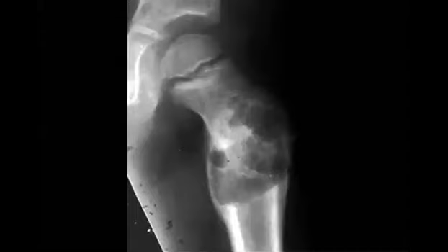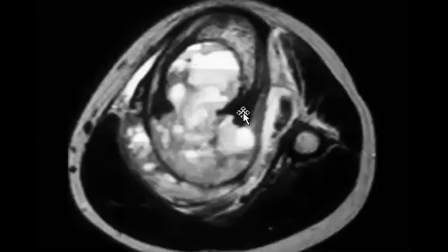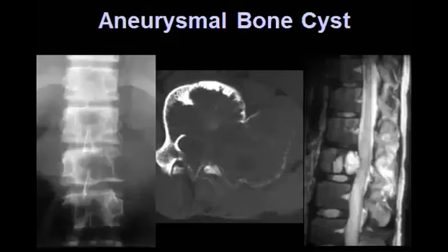And I agree with you that aneurysmal bone cyst will be one of the good differentials, especially if you see the fluid level. And you know that it is not specific for the aneurysmal bone cyst. It can be with many things, including the sarcomas. We mentioned this already. The differential diagnosis. So aneurysmal bone cyst can happen in the spine, as you see here, with lytic appearance. It can look like an aggressive lesion in the X-ray, but in the CT maybe it's fine.